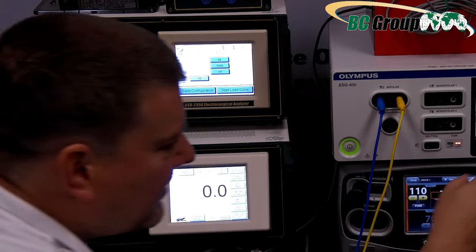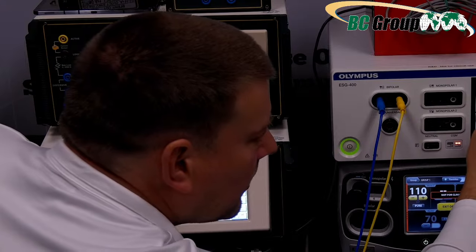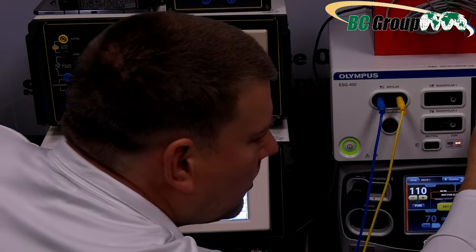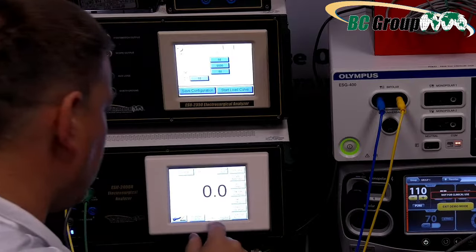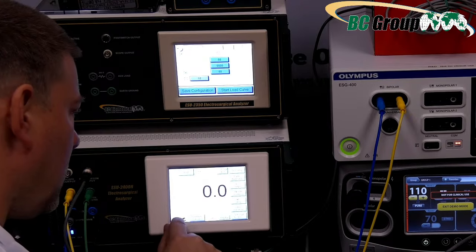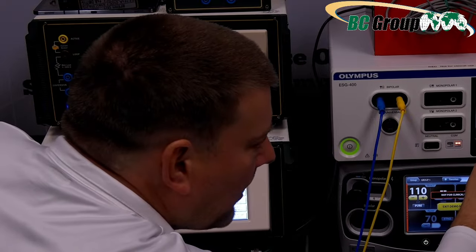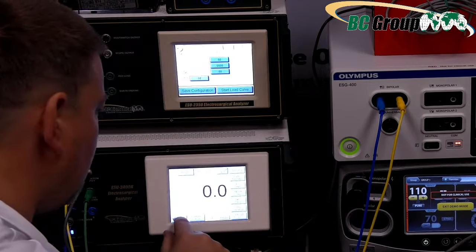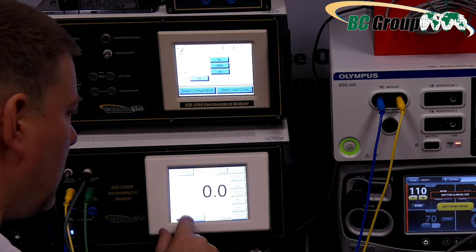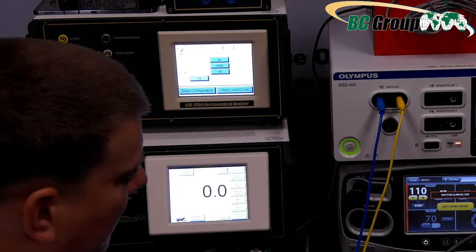Oh, we do have something. Select a mode. Okay, we're going to do bipolar on the foot control. All right. Bipolar cut. All right, guys, I'm clearly doing something wrong.